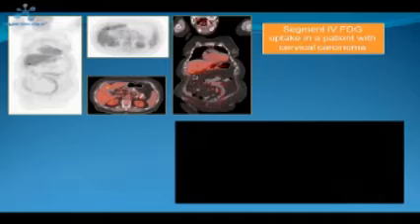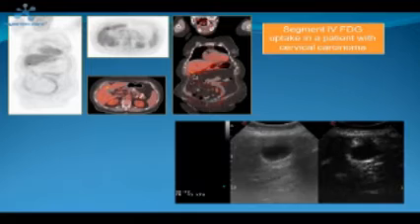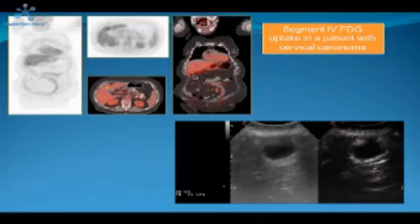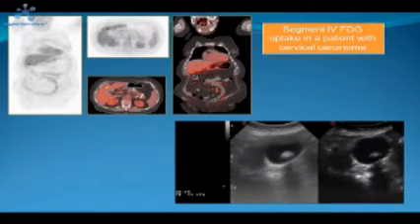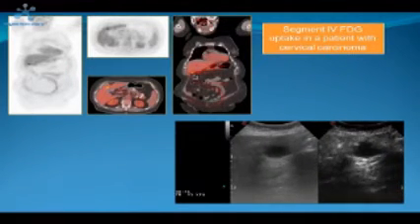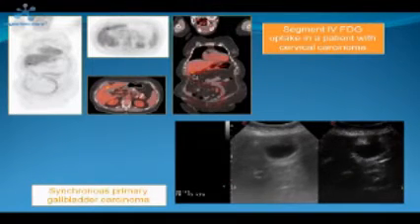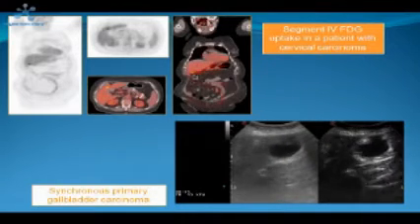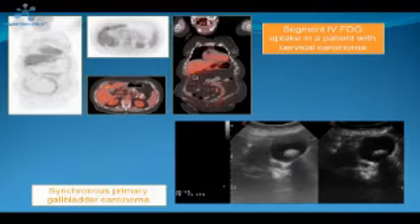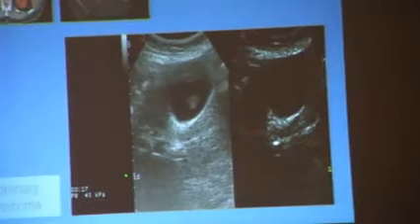So frequently we assess undetermined findings of other imaging modalities, in this patient with a suspicious uptake in liver segment 4. The oncologists called for CEUS because the oncologists in our institution have understood this possibility of CEUS, and this turned out to be not a liver lesion, but a second cancer in the gallbladder.